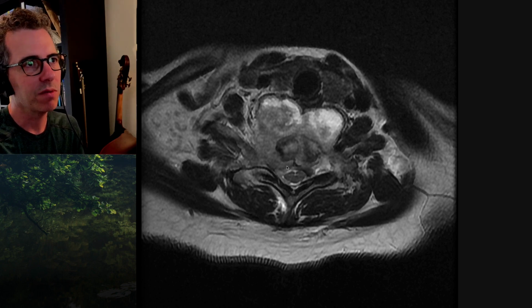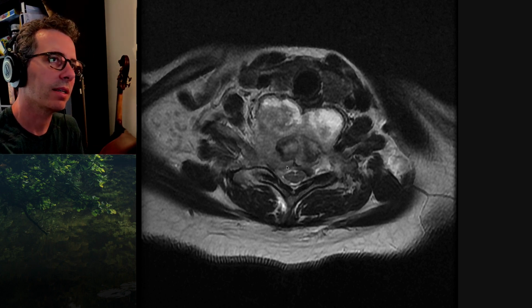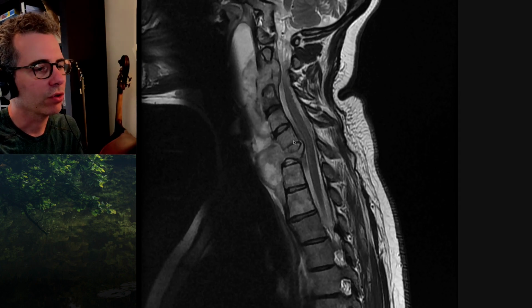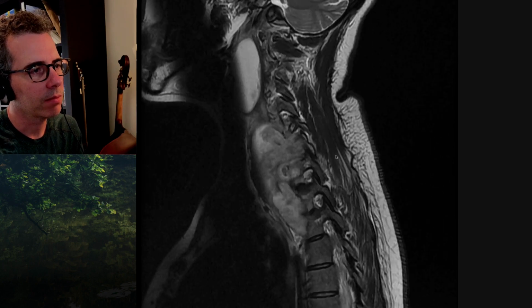Something that's sometimes helpful is tiling the stack on your PACS workstation. So bringing up 16 slices and zooming up on the cord so that you can see them all at the same time and see if it's brighter on axial. I'm not sure. There might be a little bit of high signal, but it's not dramatic. Yeah. Okay, so what do you think this is?